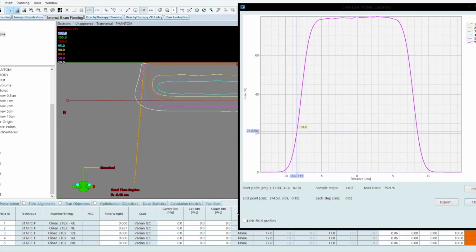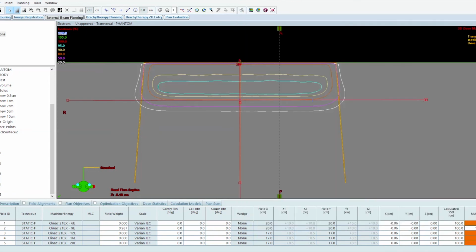And then 80 times 0.2 for the 20% isodose line is going to be 16. So if I go to 16, I'm at negative 8.6. So instead of having a 1 centimeter penumbra, now my penumbra is 1.7 centimeters. So I have a 70% increase in the size of the penumbra, and that's strictly based on the fact that I'm deeper within the patient.